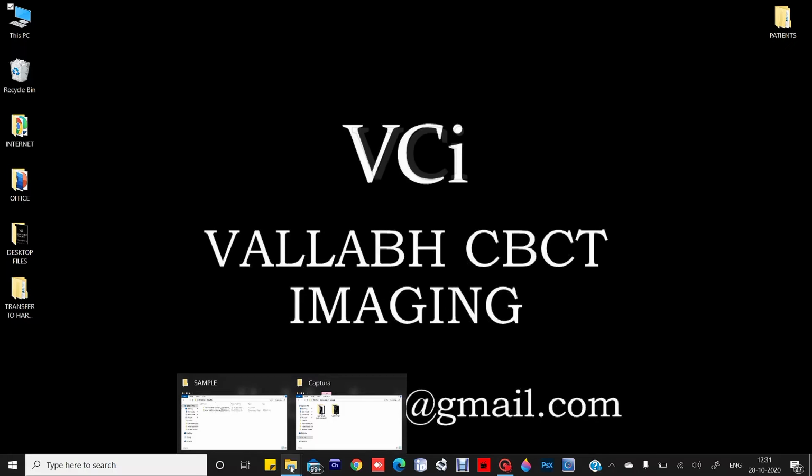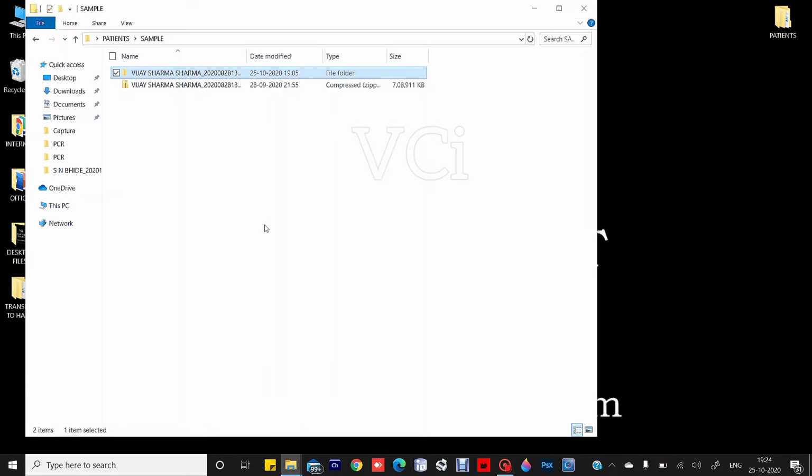Today I'll be sharing some valuable information on how to use the CBCT software. So firstly, when I send you a software, it will usually be in compressed or zip format.